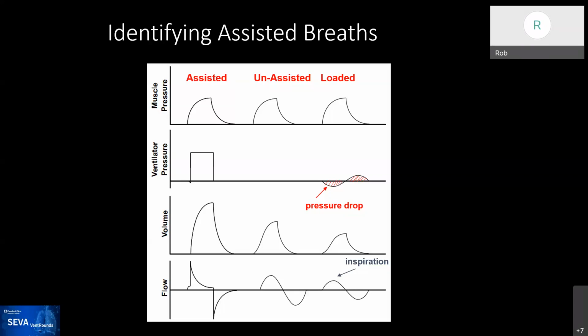For example, CPAP can be classified as pressure controlled, continuous spontaneous ventilation, let's say with set point targeting. And yet you can see right here, there's no assistance being provided. That third breath is a patient breathing on CPAP. So is the middle one, except that that's ideal. You never see a zero change in pressure at all during inspiration and expiration.